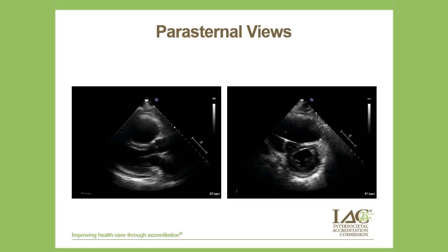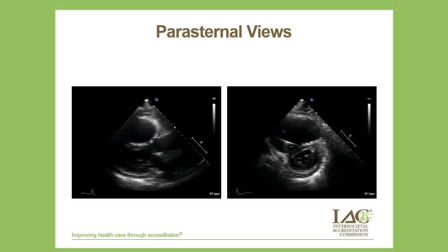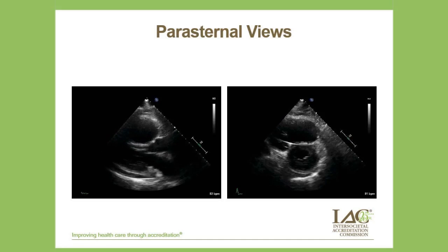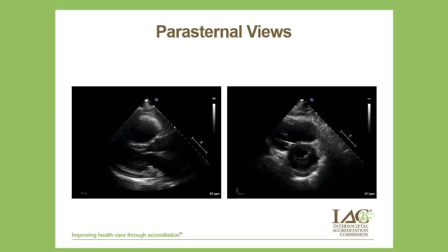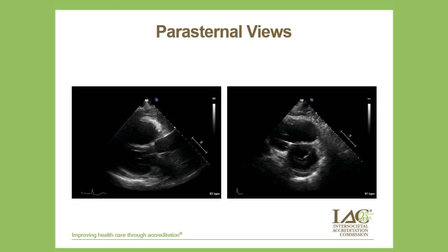Now, in these parasternal views, one can see on the screen left that the right ventricle is quite generous, and, as Pam mentioned nicely earlier, this is a view where one can estimate the right ventricular wall thickness. In obese patients, subcostal views may be a challenge, and in this case the subcostal view was inadequately obtained. So, based on this, the RVOT is enlarged, and the RV may be thick.